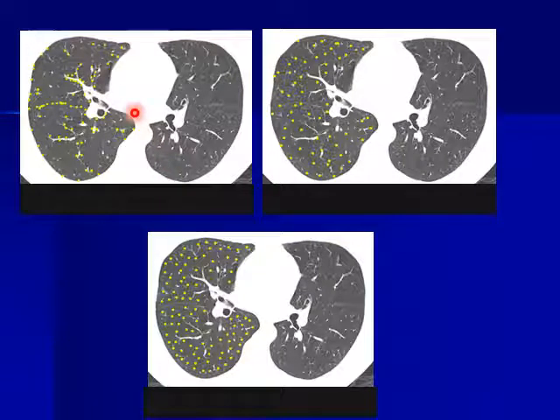Let's make this exercise. Look for these nodules. Oh, they are touching the pleural surface. Number 1, so it is either random or perilymphatic, but they are running along the fissure, along the peribronchovascular interstitium, so these are perilymphatic nodules.